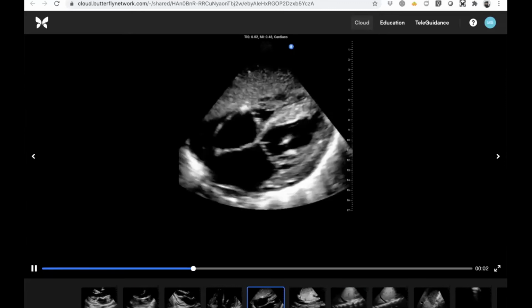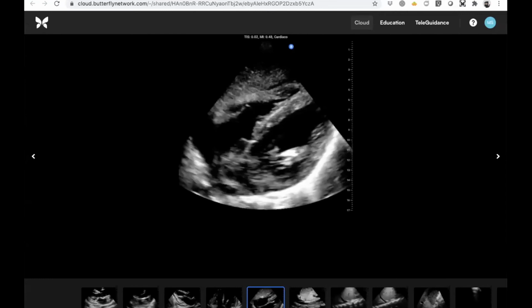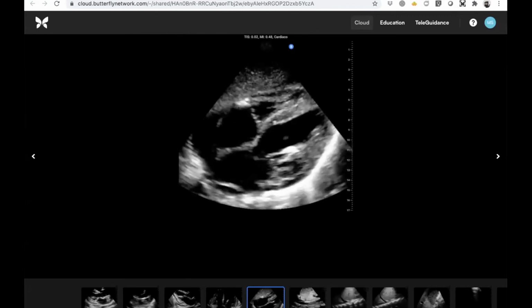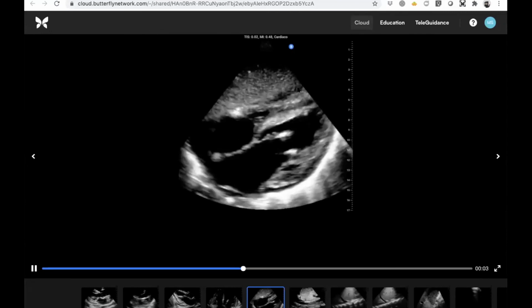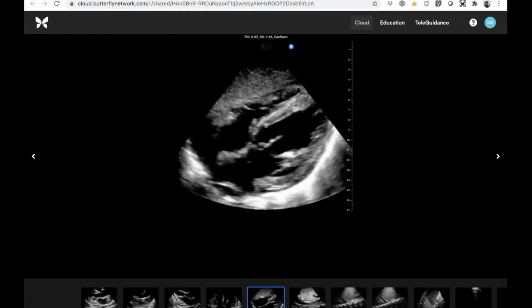Oh, sorry. I was just going to say, for image review purposes, I think this would be an example of one that we would spend more time on quality assurance for, just because you have your experts questioning some aspects of what we see here. Yep. Absolutely. So this would be in the context of a regular QA session. This one would take up some time for sure. That's a really nice spine sign, though.